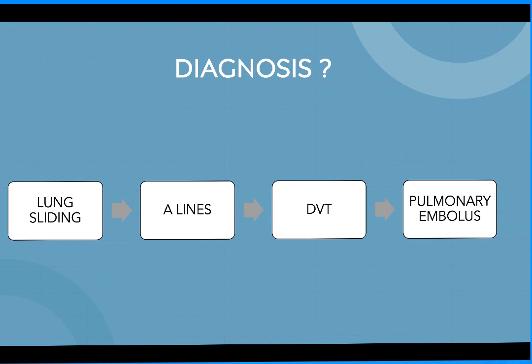This is a lung ultrasound lecture. So why on earth are we going over the DVT scan? We just diagnosed the patient with PE. Aren't there better ways to diagnose PE, like a cardiac ultrasound? I know. The reason I'm breaking it down this way is that per Lichtenstein's BLUE Protocol, this is what they did. They did not do a cardiac ultrasound for evaluation of PE.